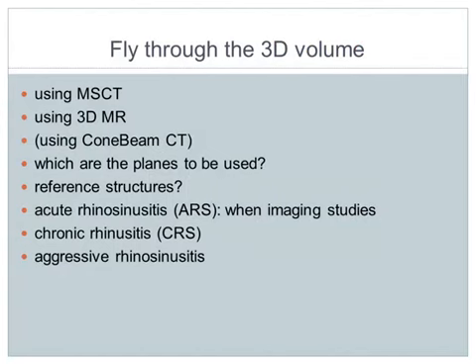But to approach this field, it is important to understand that first of all we are going to fly through the 3D volume using multi-slice CT, the technique that replaced the use of a single slice and permits a reconstruction in several planes of the anatomy and of the structures and of the lesion that will be in this framework, and also the possibility of using three-dimensional MRI.